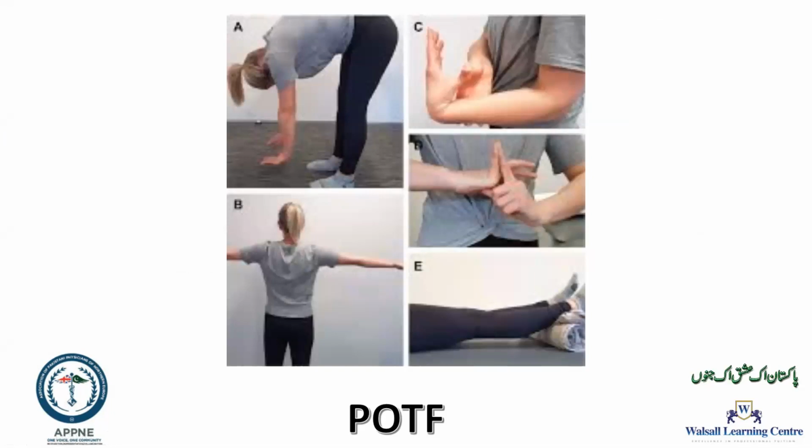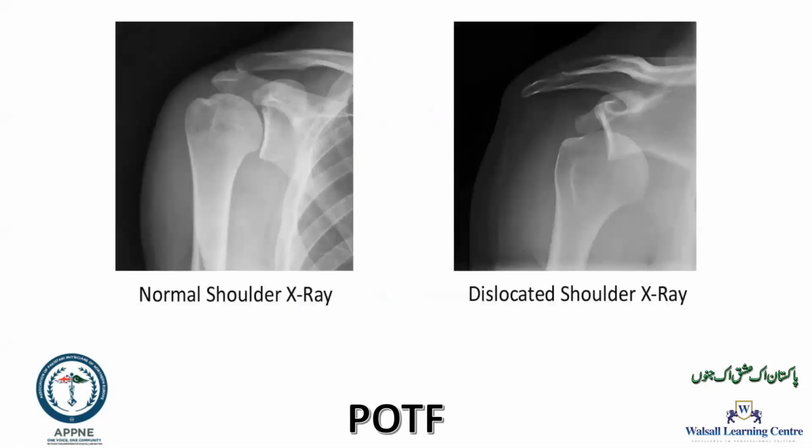Anyway, basically, we want to start on shoulder instability and cuff tears. You can see that this shoulder is intact, okay? But at some stage, it has dislocated, and you can see that from a big, huge translucency, and that's a Hill-Sachs lesion. Can everybody appreciate that? Can you see that translucency? Yes, sir. Okay, so that means something has happened, and in the past, this is what happened. The shoulder dislocated and got stuck, okay?